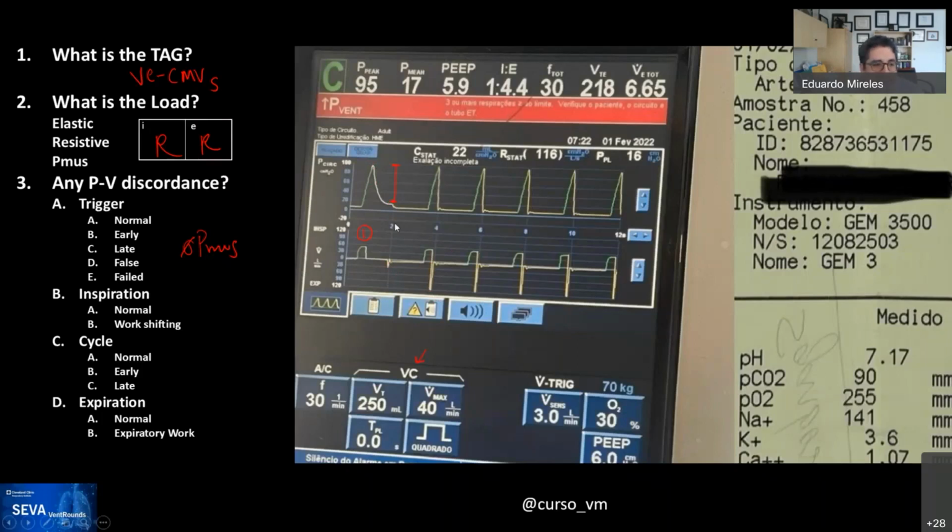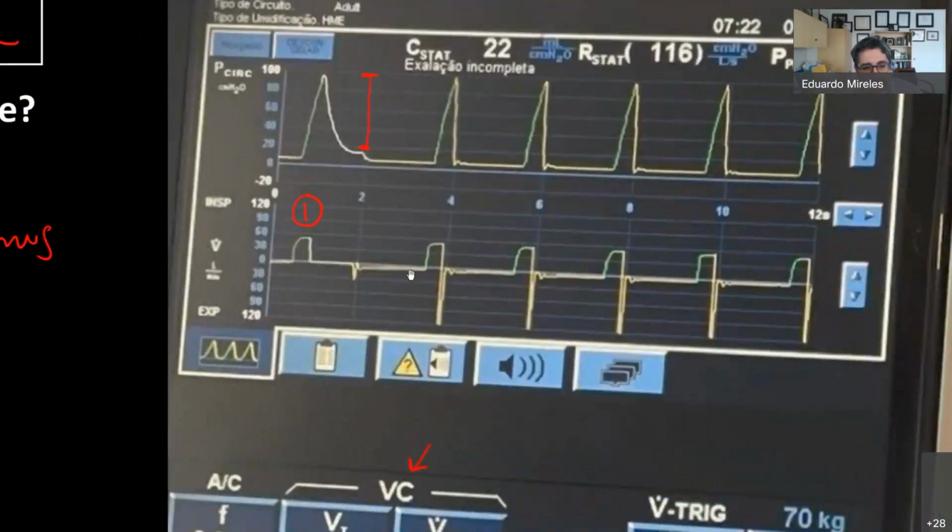You cannot see it, and this is actually one of the things that it's called sabotage, is that the way this is set right now, you have a gain that goes from 0 to 120 liters per minute. So being able to see it not reaching 0 is very hard for your eyes. Very hard. Which is what's happening to you. And you perhaps can now see those oscillations that I showed on the other one about the flow coming back and then trying to go back to the level of the pressure, and that's what that little oscillation you see right here.